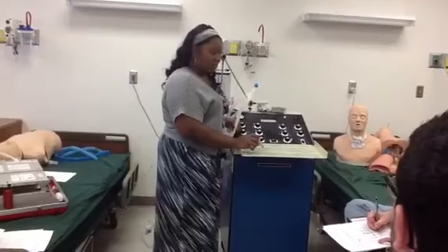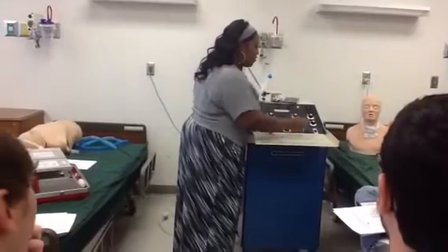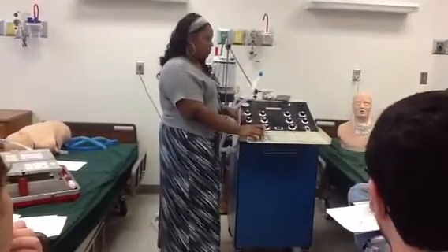Every 10 minutes. So if you set it at 6 per hour, and then you set it at 2, for how many? Every 10 minutes it will give the patient 2 sighs. Make sense?